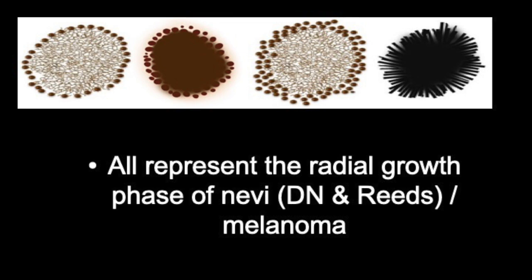And we have examples all over of melanomas that look like this, this, and this in individuals in their 40s, 50s, 60s, 70s, okay? So in young individuals, these are acceptable benign patterns. In somebody older, the same exact pattern, exactly the same, you would actually need to biopsy to rule out melanoma.